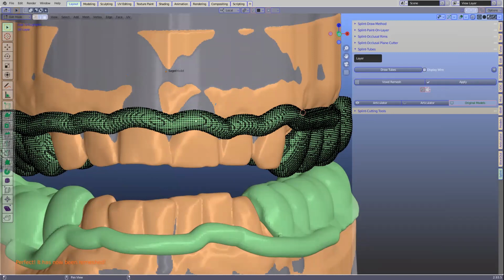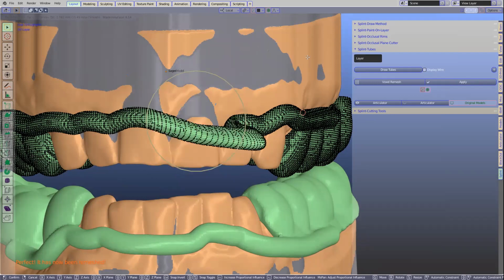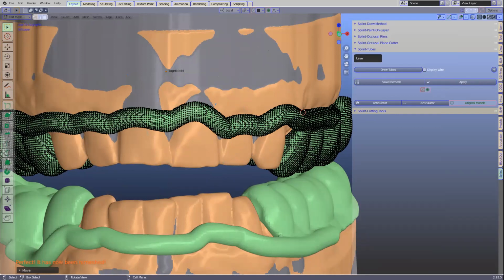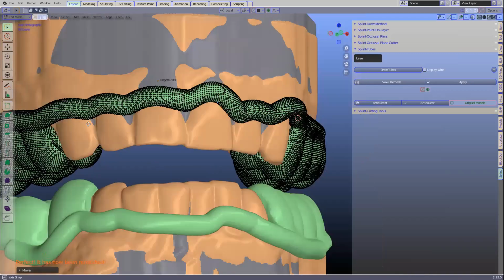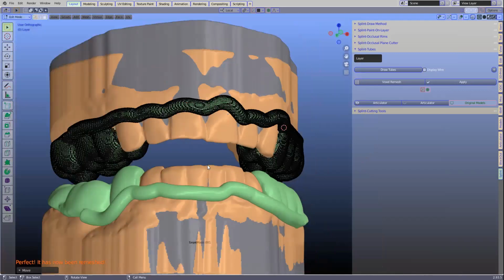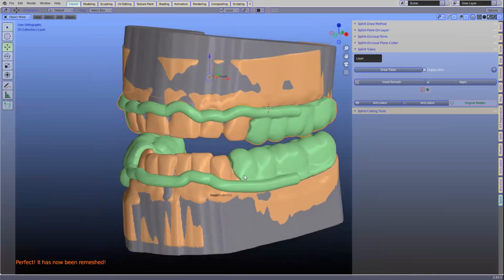So we're going to put the proportional editing on, use the G key, the mouse wheel, and we can shift this. It's like chewing gum. We can shift it anywhere we want. So this is very important to understand as well. Here we can shift the mesh in like this a little bit, move the mesh this way a little bit. There's a lot we can do with this proportional editing. It's a very powerful tool in Blender to use.